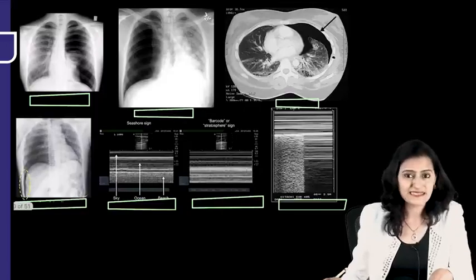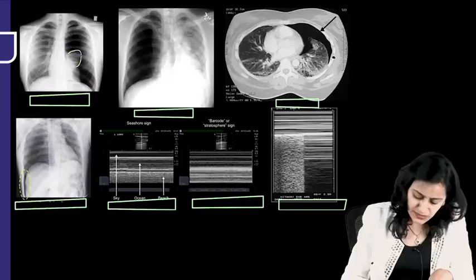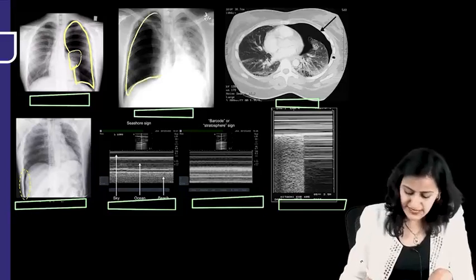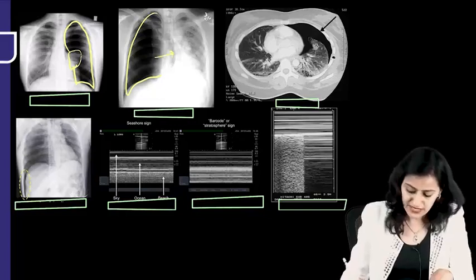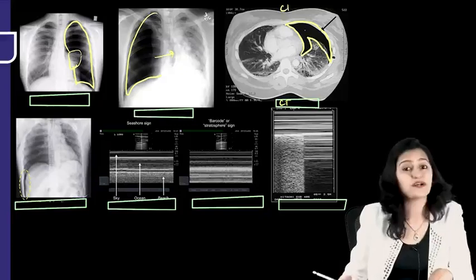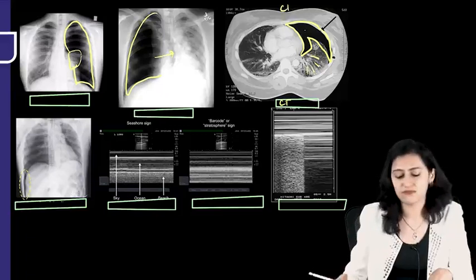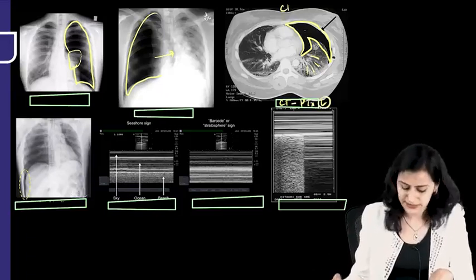Let's have a look at these. So the first image here, this again is the visceral pleural line with the collapsed lung and this is the pneumothorax. This is the pneumothorax on the right side causing the mediastinal shift to the opposite side. This is a CT scan which is showing this black air. Air is black on CT. There are no vascular markings. Look at how the normal lung has the vascular markings. So this is CT showing left-sided pneumothorax.